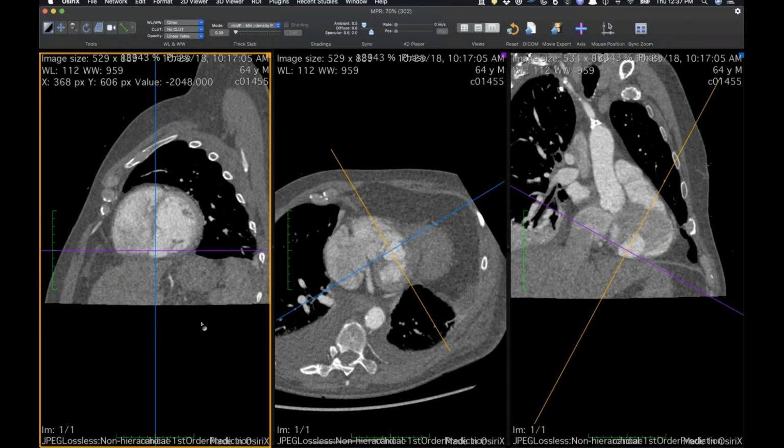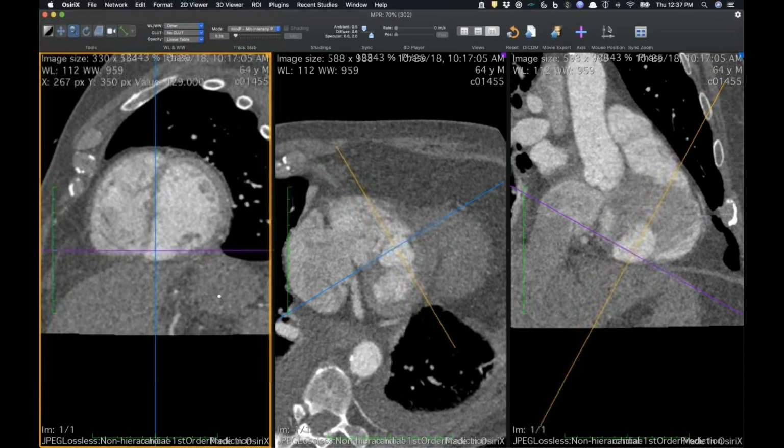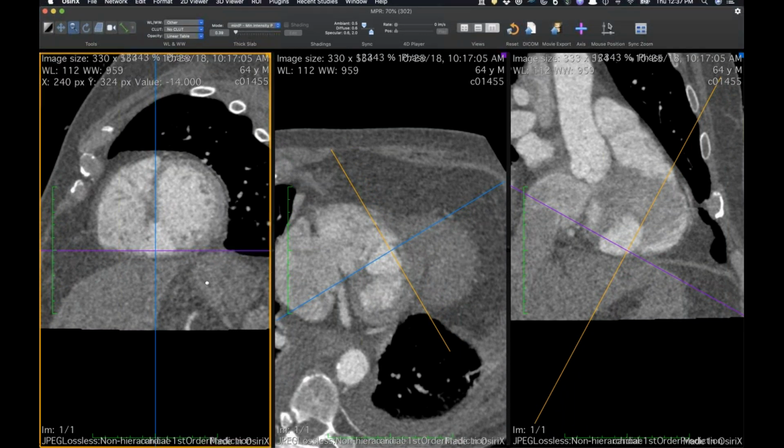Is it jumping when I do the 3D view here or not? No, not jumping. What's jumping, Travis, is your toolbar at the top. Okay. Well, the window's jumping, but just by a few millimeters, so it's not that big.